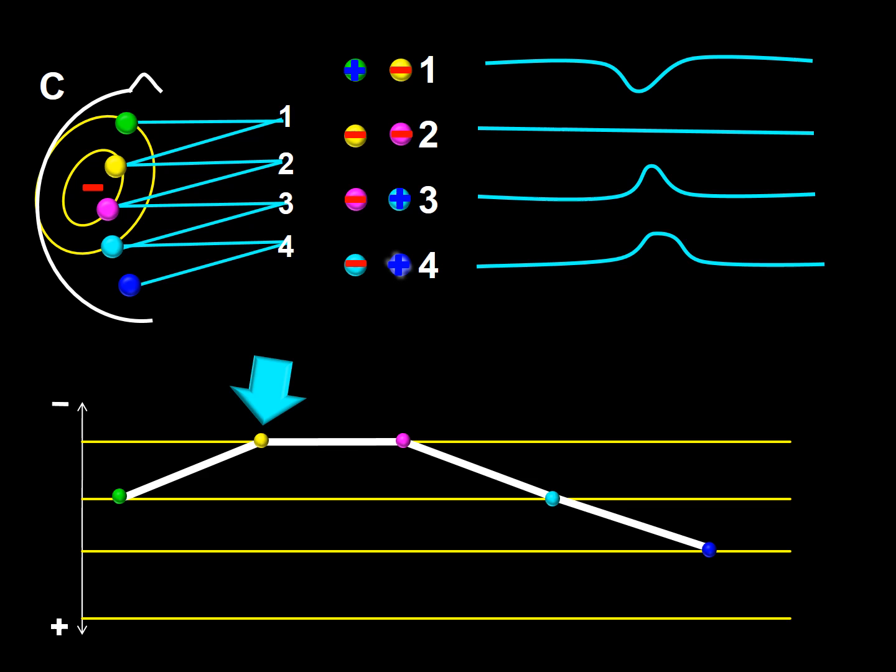The bottom line is that although the polarity, that is negative or positive, is ruled by the relation between input 1 and input 2, the direction of the wave is dictated by input 1. Next, you go to the magenta electrode. The magenta electrode is more negative than the aqua electrode, thus producing an up deflection.